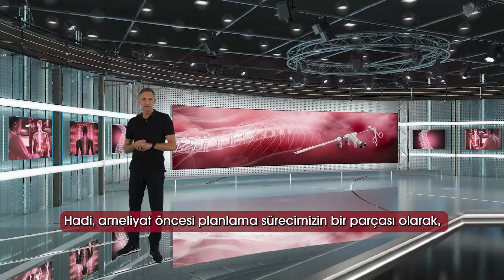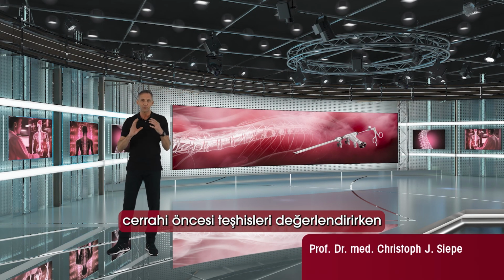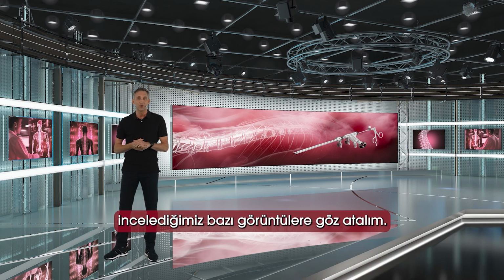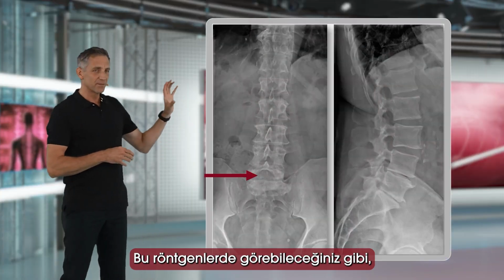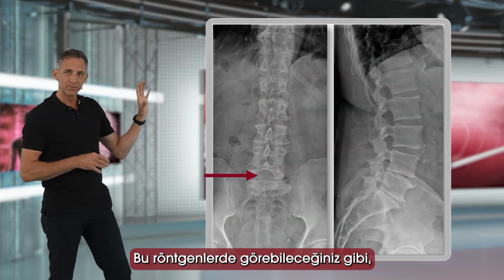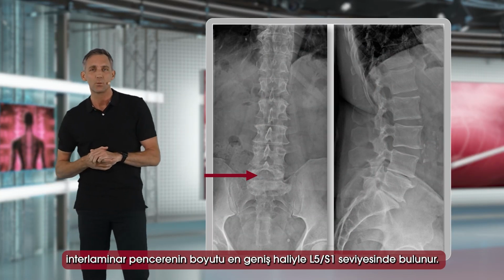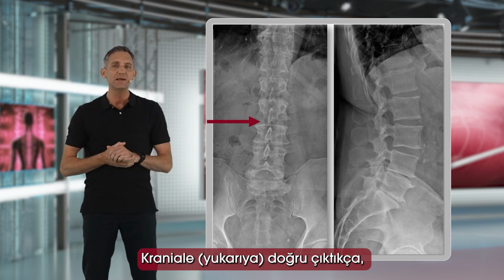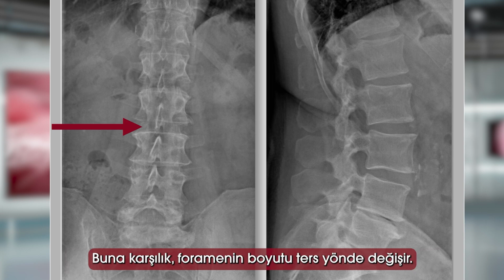Let's have a look at some of our images and what we check prior to the surgery as part of our preoperative planning and when we look at the preoperative diagnostics. So what you can see from these x-rays, for example, is that the size of the interlaminar window is widest at the level L5S1, and going up cranially, the size of the interlaminar window significantly decreases.